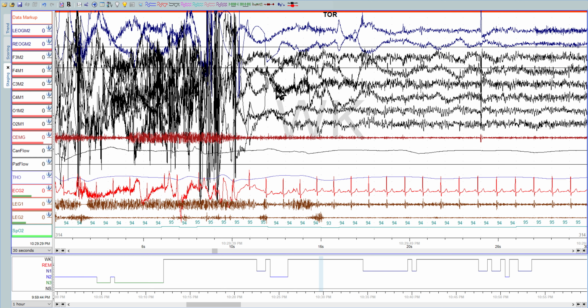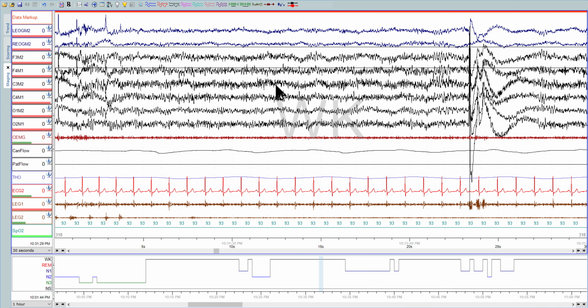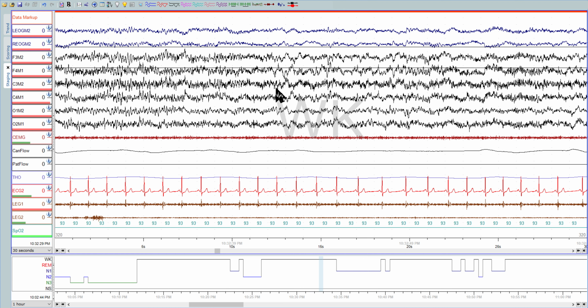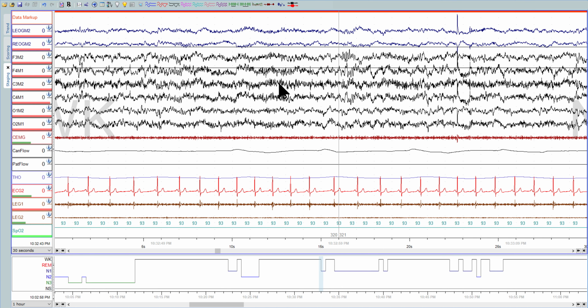Yeah, you went in to check the wires, good. Good, wake, wake, wake. A little bit of 1 right there. Wake. And then this one I think is all 1 except for right here, maybe an arousal.